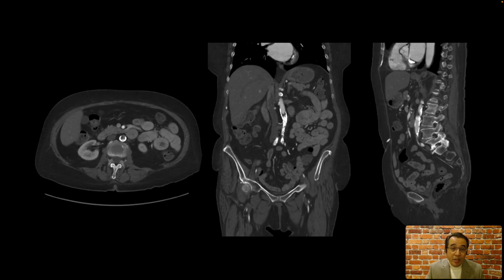This is our first patient. The finding is incidental. On their CT of the abdomen and pelvis, we find that the aorta is heavily calcified, and there is a near complete occlusion of the lumen just distal to the origin of the renal arteries. Now, vasculature is frequently a blind spot for a lot of readers, especially trainees, and so make sure you pay special attention to the vasculature and pick up such incidental findings.